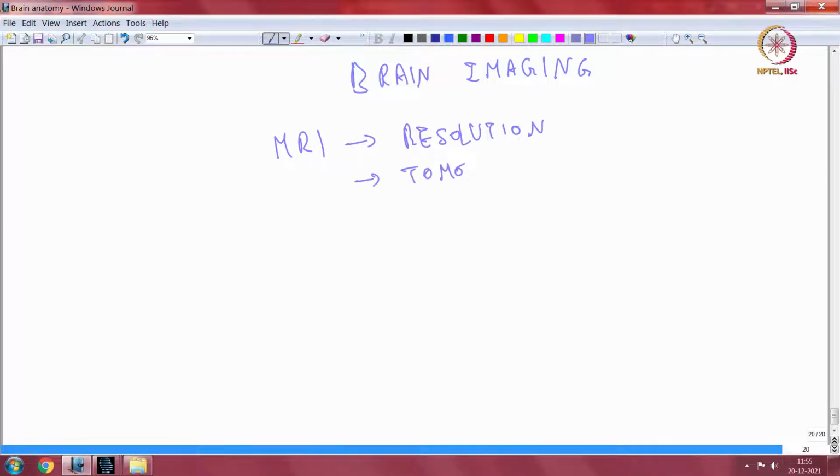You have to understand that these are tomographic, basically indicating that slices of tissues are interrogated, and you would need to know that these MR images are available in something called DICOM format. So these are keywords which you need to understand.